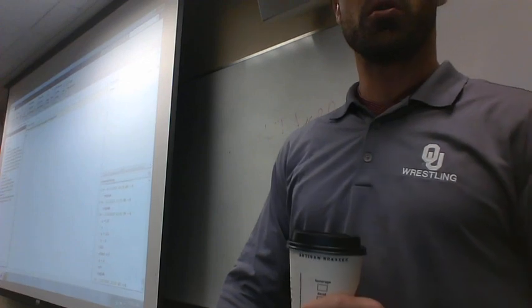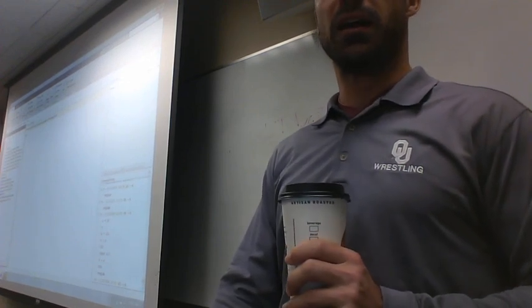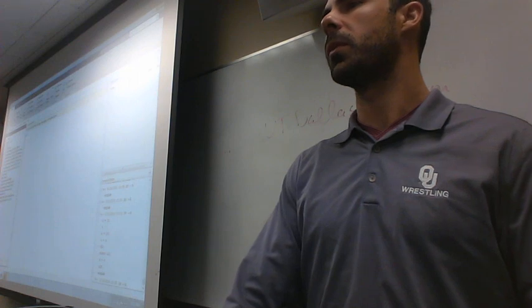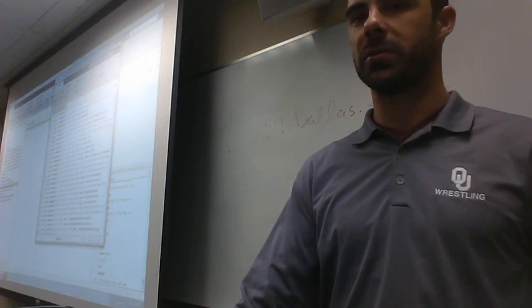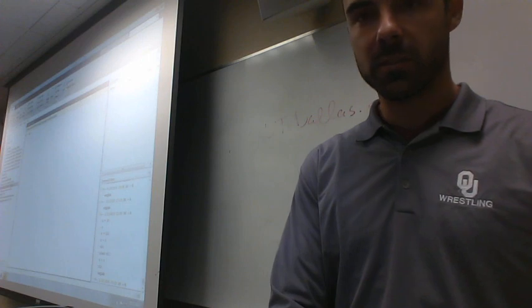Okay, so here we are. We have all of our files in here. Now, let's do a couple little things. So first of all, if we want to open up EEGLAB, what do we do? Yep, type eeglab. Well, you have to actually be in the command window. eeglab.